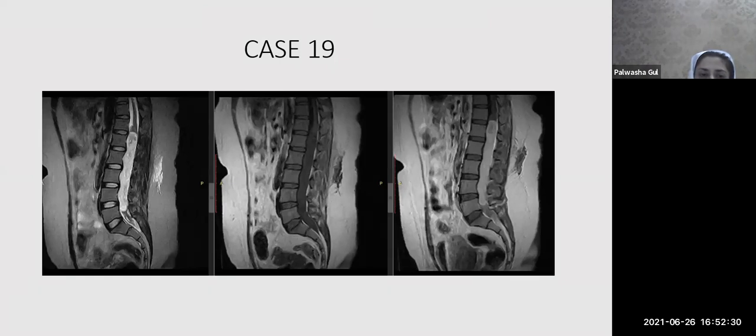And in this, ideally, you should also go for imaging of the entire spine, because this could show you multiplicality. This could show CSF dissemination, and this could show you multiplicality, okay? So from an exam point of view, we are always memorizing medulloblastoma, drop metastasis, pineoblastoma, drop metastasis, etc., but we are never considering the fact that ependymoma also shows CSF seeding and multiplicality. So keep that also in mind when you are in your exam or maybe in your clinical practice.